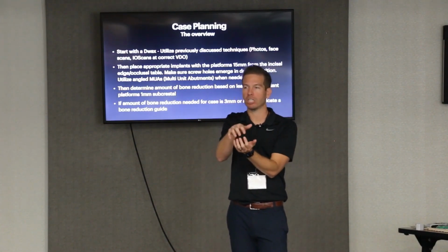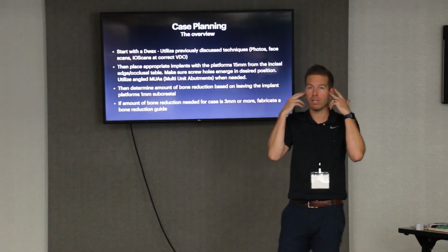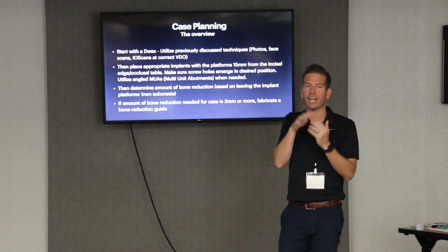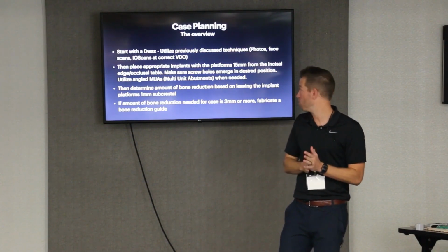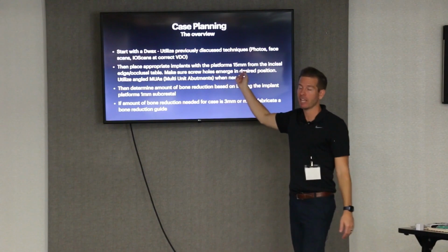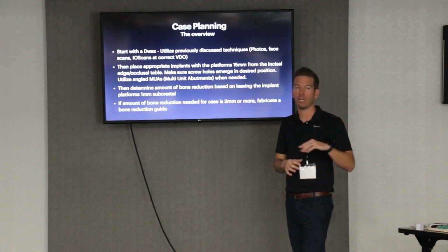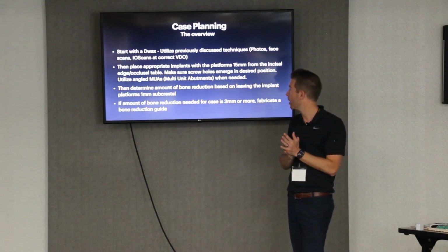And anytime you digitally open up the mandible, it works, but you're based off some unknown hinge of where that condyle is. So you lose that accuracy versus literally scanning their bite at the VDO that you want. And so face scanning, we did that last time. I have LaToya's case loaded on all the computers with everything stitched, face scan in there, so we can start thinking about that stuff.